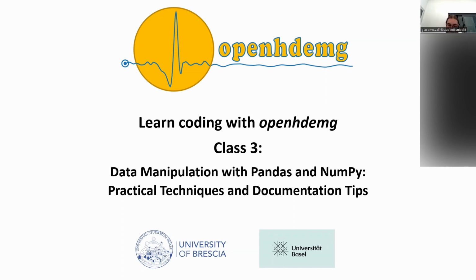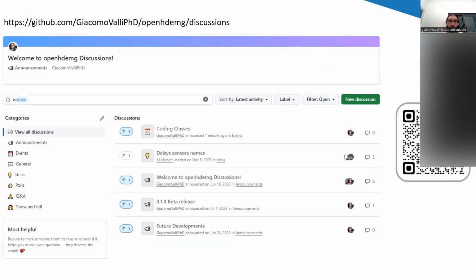The documentation is the most important place where you can find all the information you need for your coding, but it is not of immediate understanding, especially if you're new to Python. And so we will walk a bit through some of them, some that may be interesting, at least in this first part of the classes.